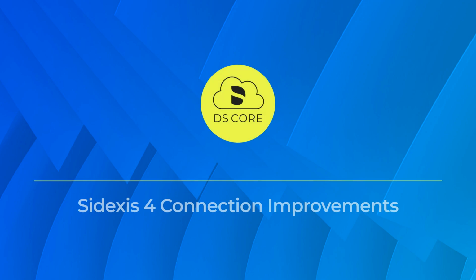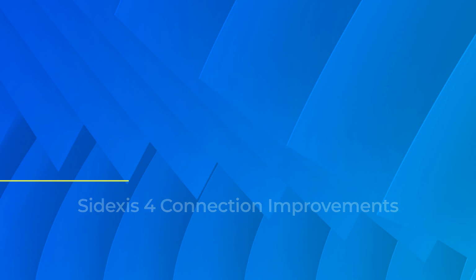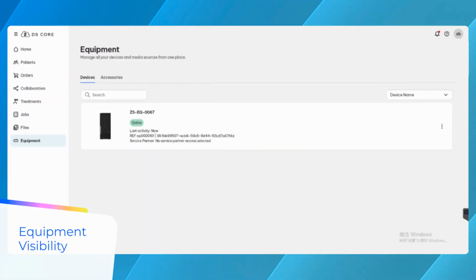The following tutorial describes the new notification system, enhanced equipment visibility, and how DS Core responds to different file uploads from Sidexis 4. Let's begin. First, let's check the equipment overview.